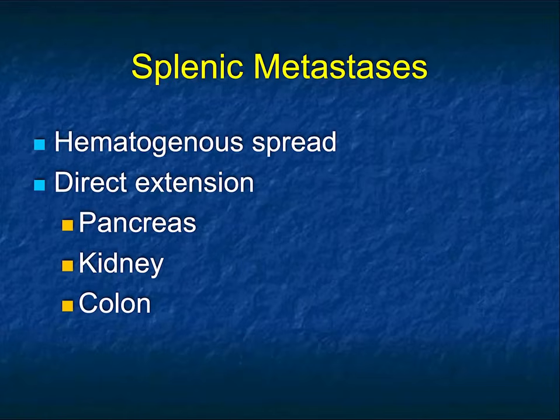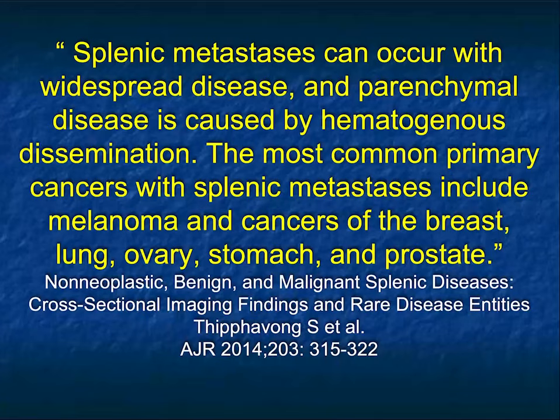We then talk about metastasis. You can have involvement of the spleen by direct extension, most commonly pancreatic carcinoma, tail of pancreas lesions to be specific. You can have a malignancy of the upper pole of the left kidney, gets large enough, can involve the spleen, and also tumors of the splenic flexure of the colon can directly involve the spleen. I've occasionally seen a jejunal tumor, but then the tumors are really large and really aggressive and essentially spreading everywhere.